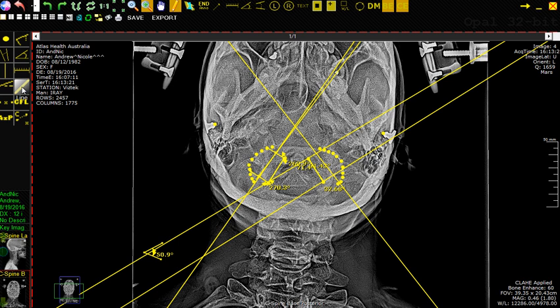And so what we would normally do is draw a line that is horizontal from one side to the other like this. And then we would draw another line that is exactly perpendicular to here. Now I can do that using the angle measurement tool. That's one way. Or I can use this horizontal orthogonal angle again. And so it would look something like this, drawing it from here to here. But as you see, this is kicked way off to the side here.